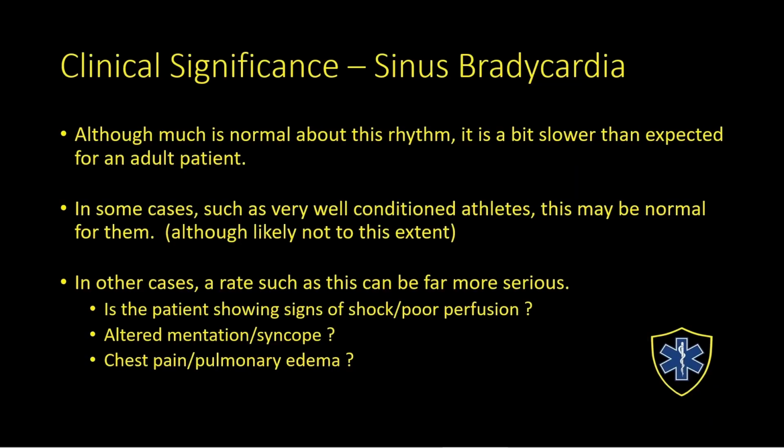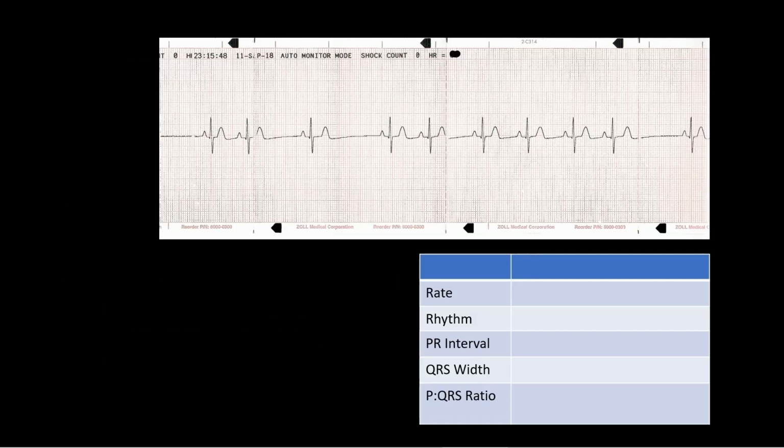Alright, let's move on and try looking at some other rhythms and see what we come up with. Ooh, let's look at this one here. Now, as we look at the monitor, again, the first thing we want to do is determine what the rate is. Now, as we look at this one, we see the rate here.